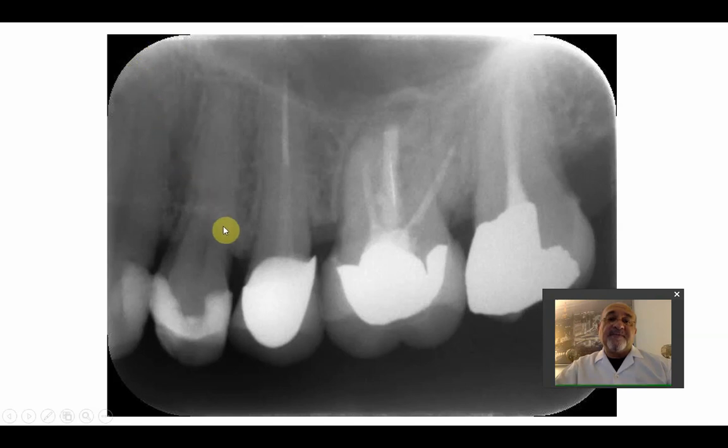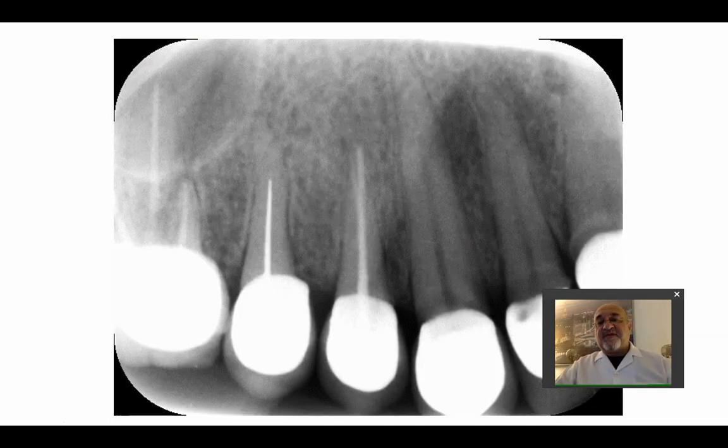See this line? Compare this shadow over here, the radio-opacity, and the one here, this triangle. This appears more radiolucent. This line actually demarcates the naso-labial fold. Again, it will cast its shadow, so we should take care of this appearance. Here it's more clear, this one.